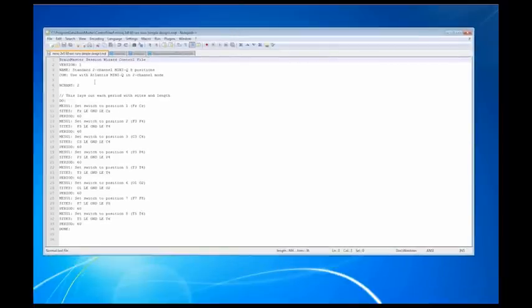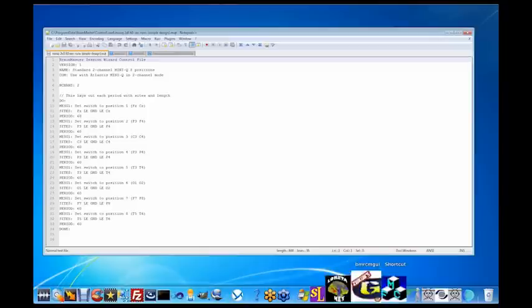For those of you who have a MiniQ, this file probably looks very similar to what you're used to. This is just a 2-channel MiniQ session that does 8 positions. I want to break this down and show how it works. As you can see, the period in here controls how long this session is going to run. The thing about the SessionWizard is it overrides everything you might have set in your session already.